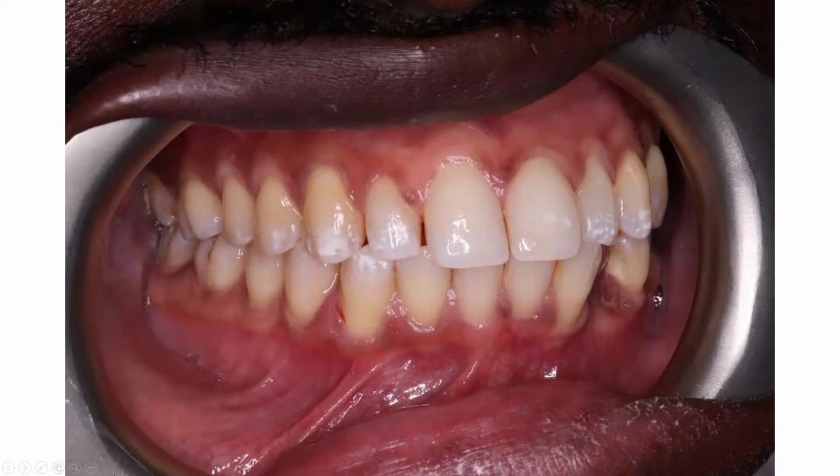This picture again shows the spacing in the upper arch. Note the spacing to the mesial and distal of the upper right lateral incisor, and also the canine. It doesn't appear to have a space distal to it because of the way the picture is taken, and this is why it's always important to look at the occlusal view of teeth as well, because we do know there's a space distal there, although it doesn't appear on this picture.